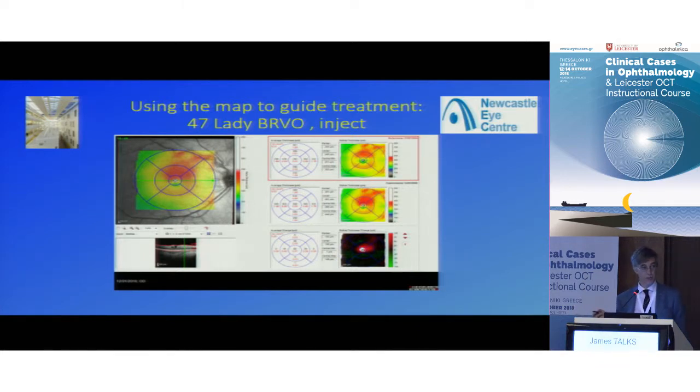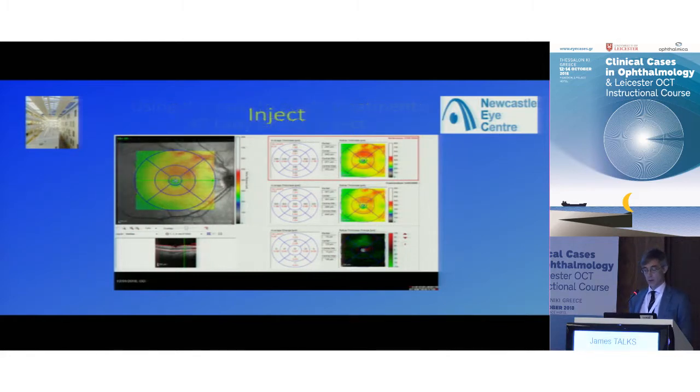This lady is a younger patient, only 47, so I did inject them. And the fluid comes down quite a lot. The map improves. You can see before and after, and the cystic fluid's gone. And indeed it continues to improve. We do our 3 injections. Then we decided to observe.